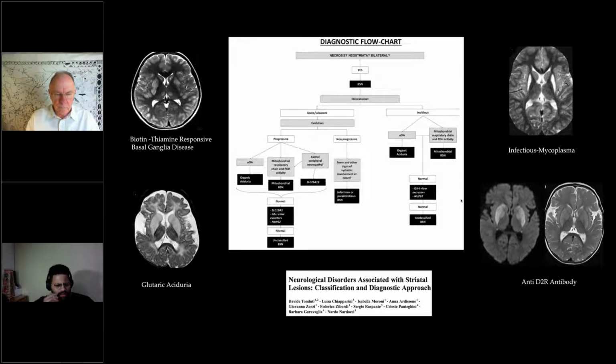Dr. Lokesh, now we had clinical differentials where because hyperacute onset, we thought of viral encephalitis as a primary differential, especially something like JE or dengue associated encephalitis. But there is no restricted diffusion. This is a hyperacute scan. I think it was done within 48 hours after the symptom onset.